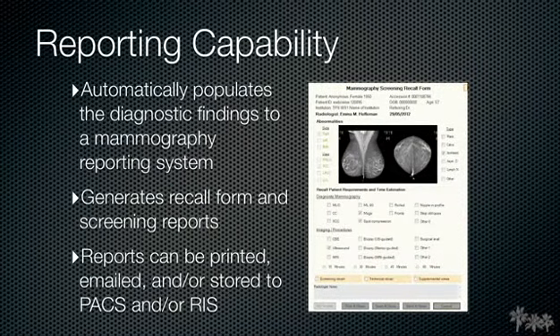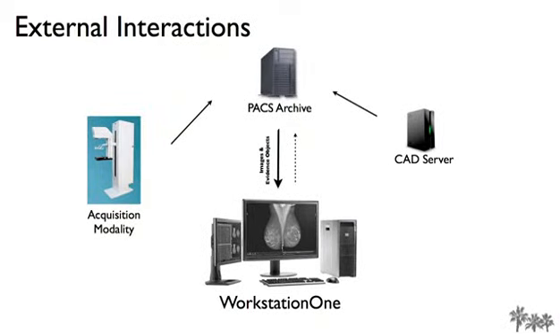In the reporting step, the workstation automatically populates the diagnostic findings to a mammography reporting system. You may also generate recall forms and screening reports. Reports may be printed, emailed, and/or stored to PACS and RIS. The workstation prefetches images based on an interpretation worklist in order to manage high throughput. And in order to improve reading efficiency, we automate the viewing workflow for you.